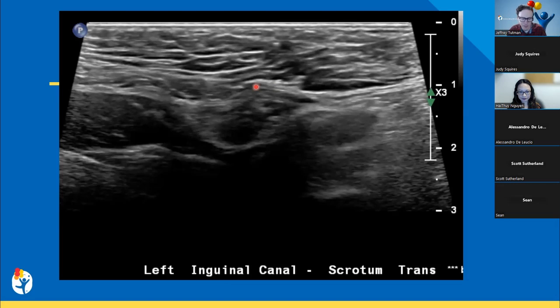So, urology felt very comfortable making the diagnosis of intermittent torsion. So they took him to the OR the same day. And by the time he got to the OR, they found a 360-degree twist in the cord. So at some time after this second ultrasound, he had kind of partially torsed. So again, this is kind of making that distinction between clinically when they think there's an intermittent torsion versus when they kind of treat things more conservatively. This was the case where they felt very comfortable clinically making that diagnosis.